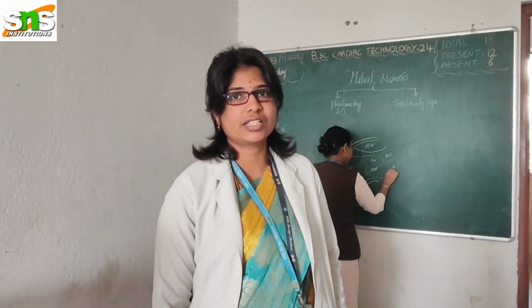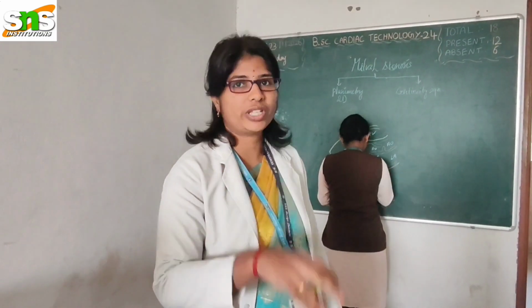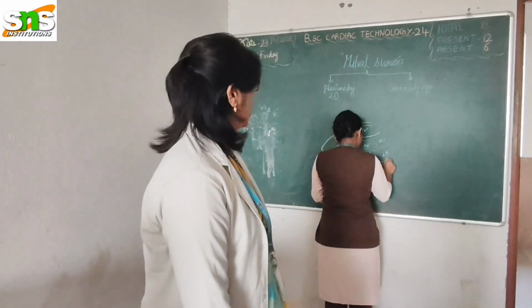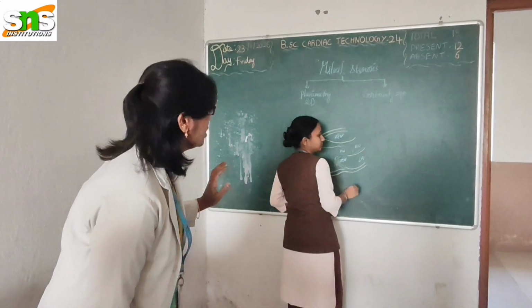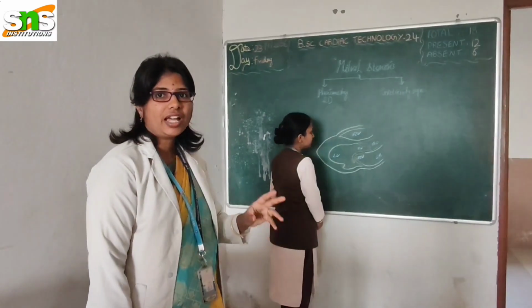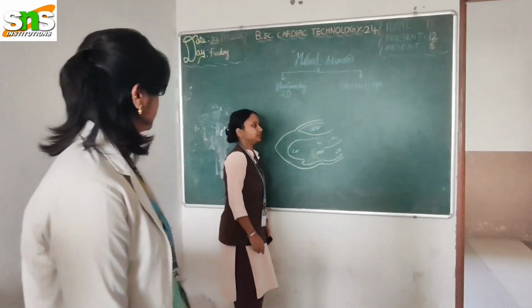Hi all, this is Kavipriyabalu, lecturer, Department of Cardiac Technology. In this video, we would like to assess echo assessment of mitral valve stenosis from 2D. And here, Sneha will explain how it will be on valve appearance in 2D and which valve gets obstructed and the doming appearance.